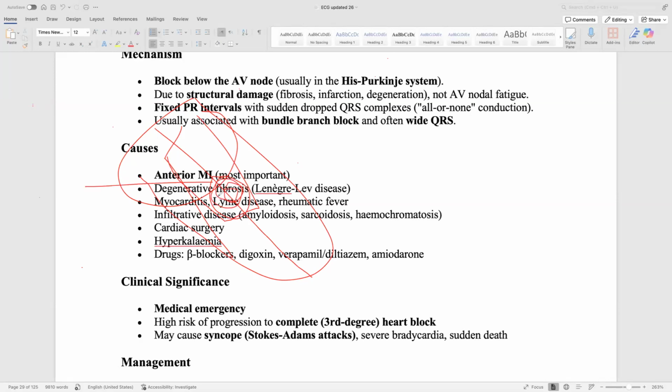The area inferior to the AV node is the septal area, supplied by the left anterior descending. Which is serious. So we need to link Mobitz type 2 to anterior MI. It is not just diagnosing the MI, it even localizes it.